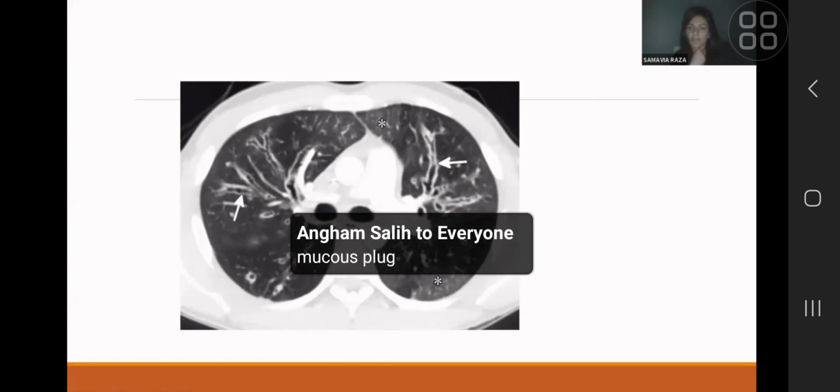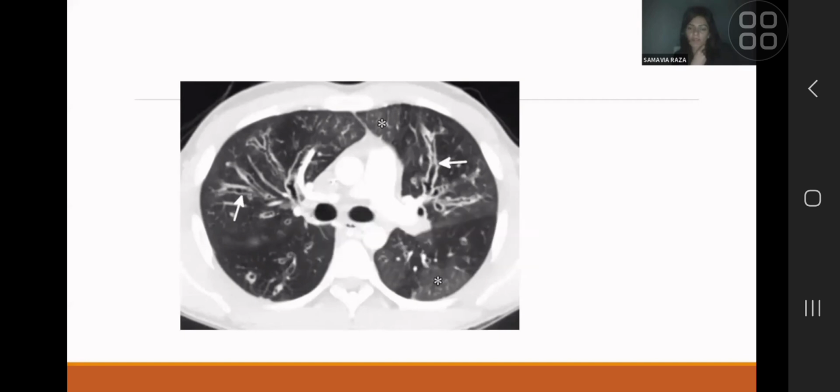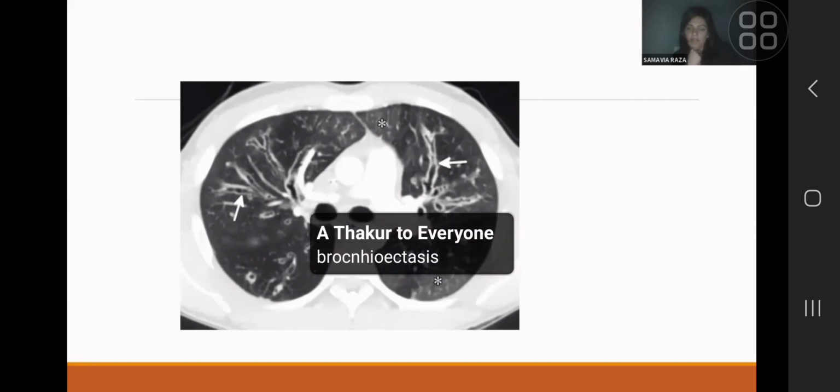So there is bronchiectasis. Yes, exactly, Dr. Mahesh. Perfect. So that's bronchiectasis, and there is bronchial wall thickening. Bronchiectasis just means dilatation. When the wall is thickened, you also have to mention that because that means chronic inflammation and possibly superadded infection.